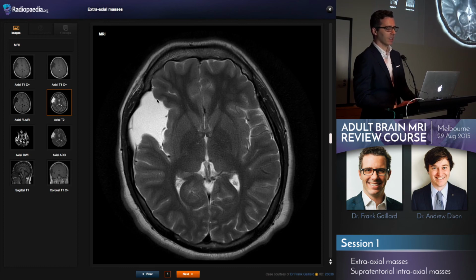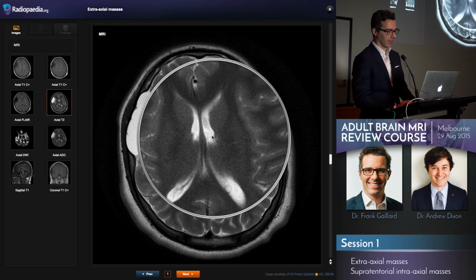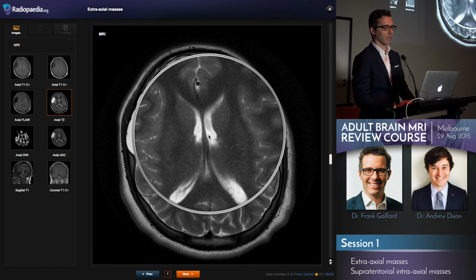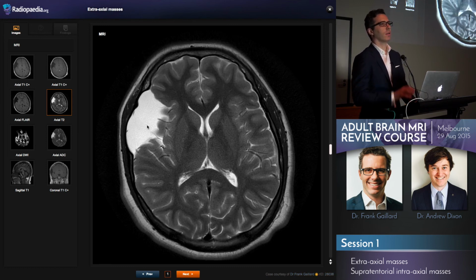The other thing that can be seen, especially in smaller cysts, is that they're hyperintense to normal CSF. That's not because the CSF inside them is somehow different. It's that normal CSF has to-and-fro pulsation during the cardiac cycle, which on T2 will cause it to lose some signal. You can see that here in the frontal horns: this slight blooming loss of signal due to CSF having jetted through the foramen of Monro. Because CSF is confined to the arachnoid cyst, it won't have that as much. You might get some turbulent flow, but usually it'll remain very homogeneously hyperintense.